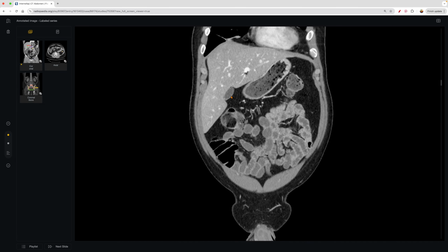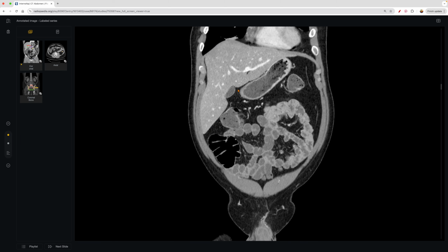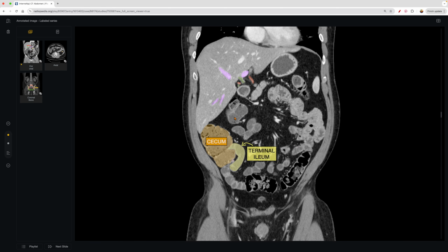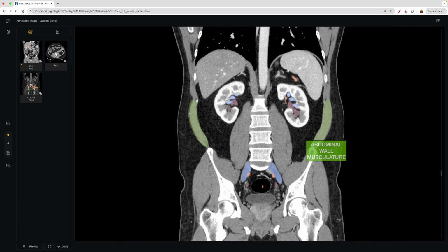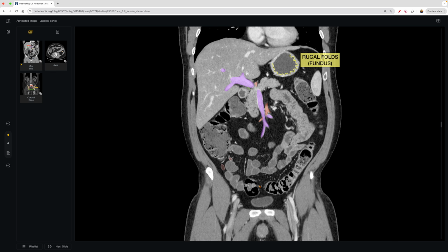We can see the gallbladder coming here, that little structure. Sometimes it's absent, right? So just keep that in mind if you don't see it. And then, when we start from the stomach, of course, you can see the small bowel from there. But sometimes it's also easier to start with the rectum and then start all the way up from the large bowel and then trace that out and go from there as well.